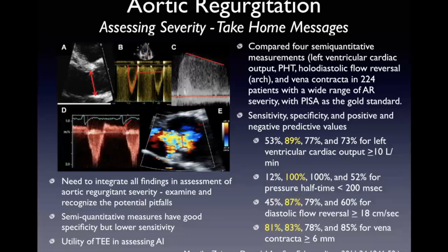Yeah, so I think it goes to the threshold as to how good the endocardial definition is to allow accurate tracing. And I can tell you as a reader, and part of it is your experience as a reader, it's way easier to trace in the presence of good contrast LVO. In the absence of contrast, depending on how many trabeculations you have, sometimes you're not sure.